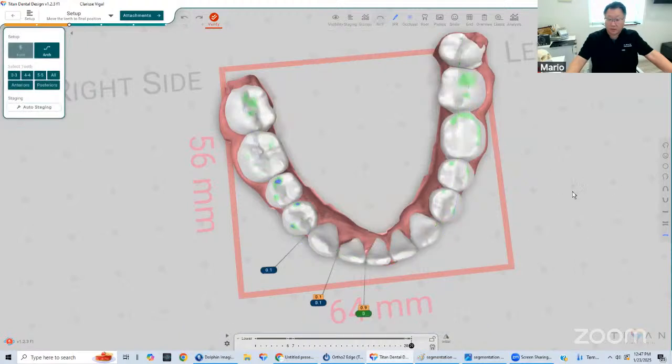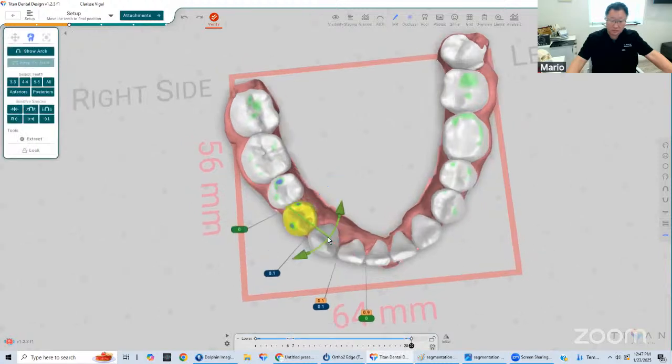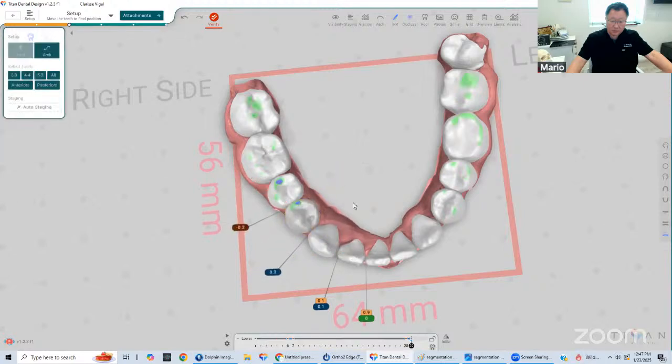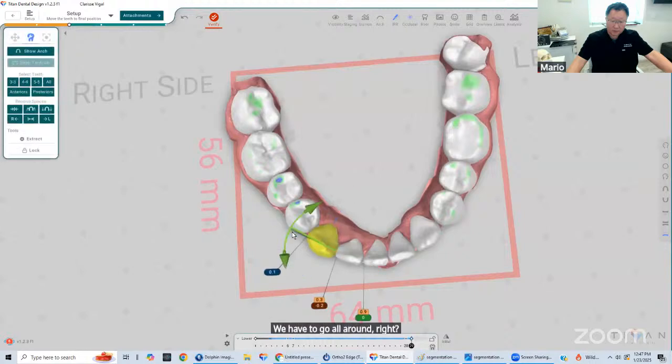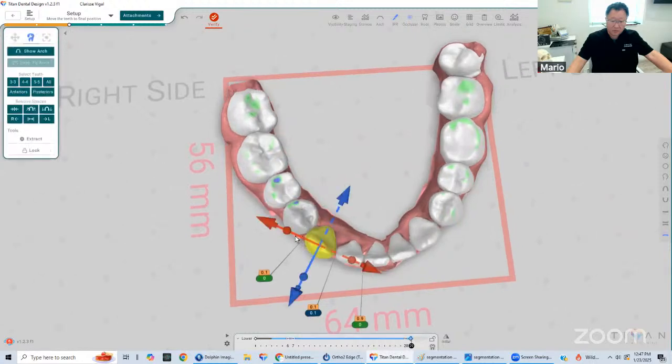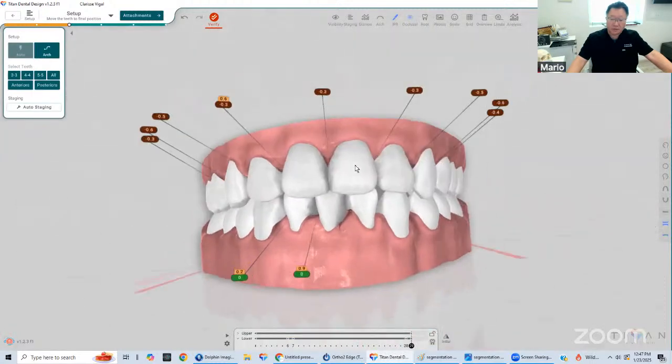So I'm going to take that out. Bring this in a little. We have to go all around, right? Back up and look.